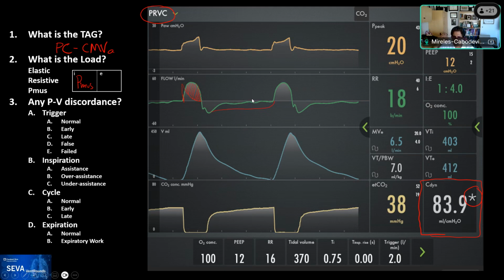So those are just for you to consider, and I'll show you what we did in a second. So the expiratory, I would say that it's resistive for us to discuss. I also want to highlight that during inspiration, the flow actually looks sinusoidal, which would be what I would expect to see in a patient breathing spontaneously. So just keep that in the back of your mind.